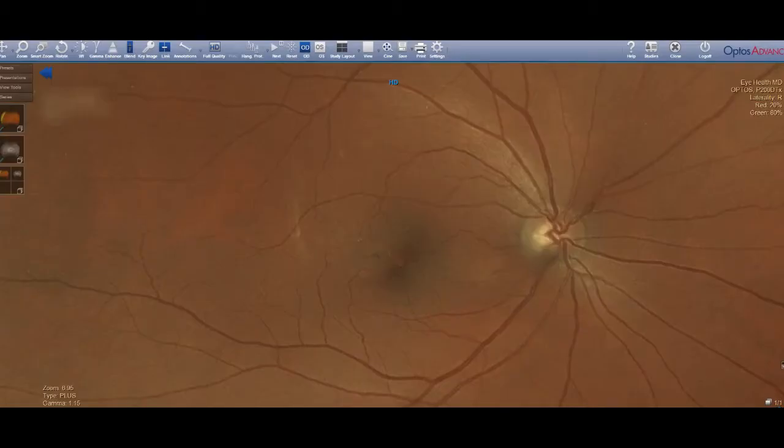Let me just pull up a color image for you of the right eye, and this might help a lot, right? You can see this area of pigmentation on the temporal aspect of the fovea. You wonder if these vessels are a little bit right-angled, a little bit abnormal. You've got these dots here. I agree, you can't tell on this image if those are some drusen or hard exudate, or actually the crystals that we talk about with IMT or idiopathic macular telangiectasia, but you've certainly got a few changes that would alert you to something going on.